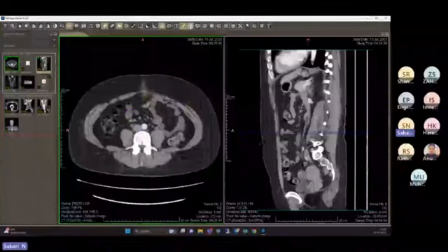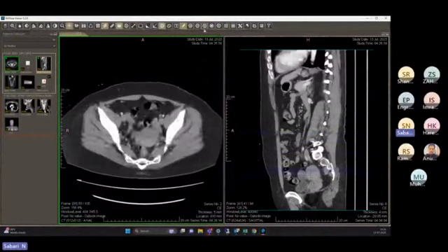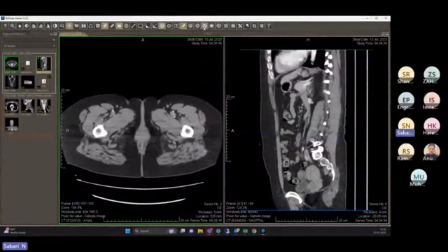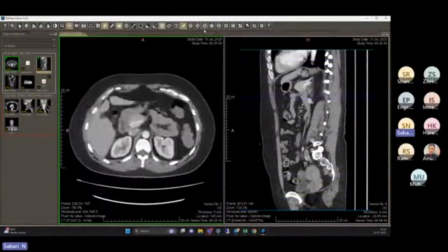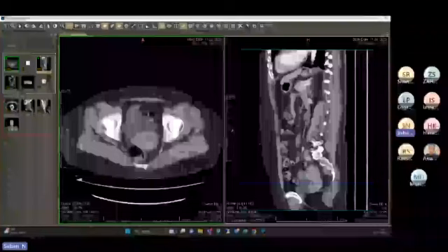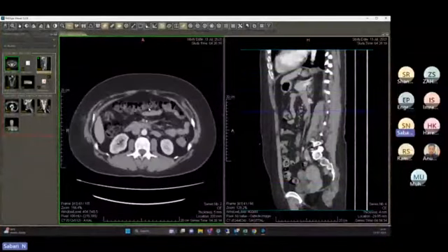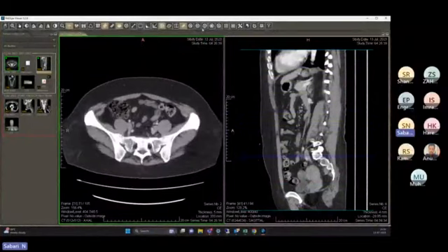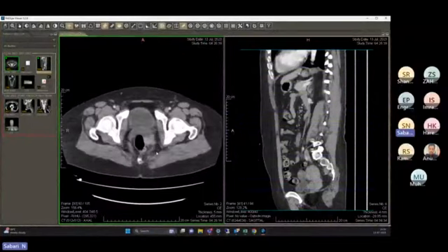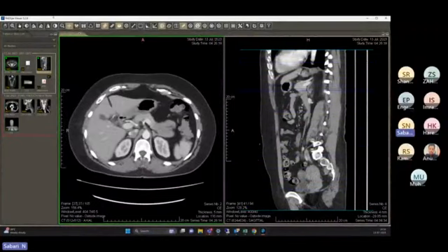And this is for going to the previous series. This is pause, and this is play of the cine image. Cine image is basically when you open multi-frame images, they want to view them in cine, like ultrasound images, angio, especially in the angiogram. When they are doing angioplasty and CTP, they want to use the cine because those are multi-frame images. If they find something, they want to stop, and yes, they can pause.